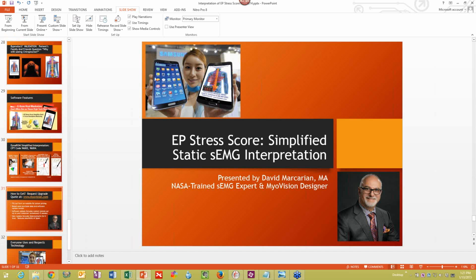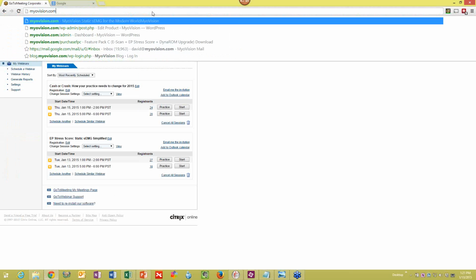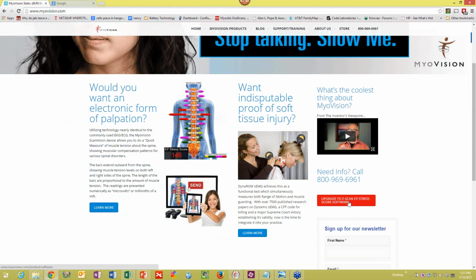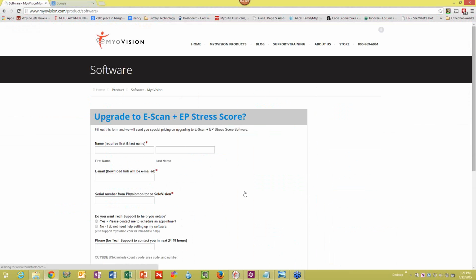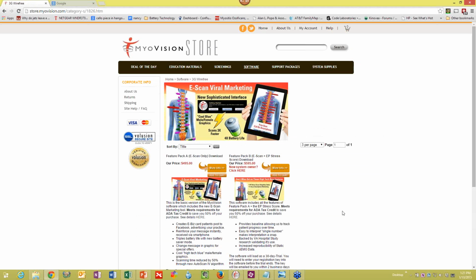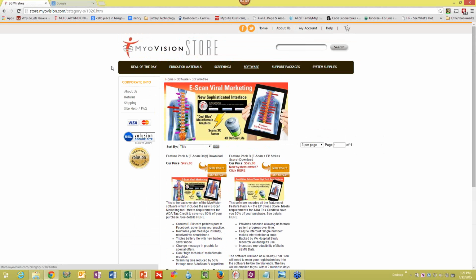So let me show you where this is. We go to myovision.com. You can see right on the main page, all you have to do is click on upgrade to EP stress score and eScan. Click this link and it takes you to a form you fill out. Simply put your information in and you'll be contacted via email as far as the actual cost for the software. You can also go to the store, and you can see the store has the software located here too, and you have the EP stress score one. If you are a new owner, simply click this, fill the information in, and you'll get a link for downloading the latest version of the software.